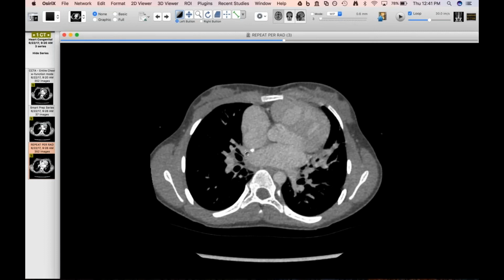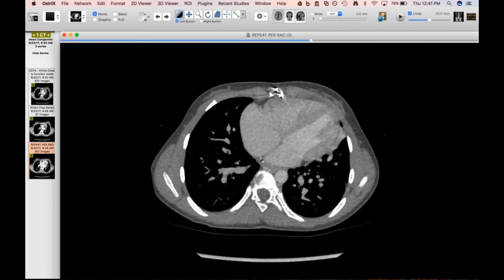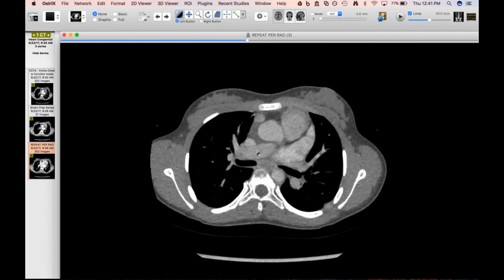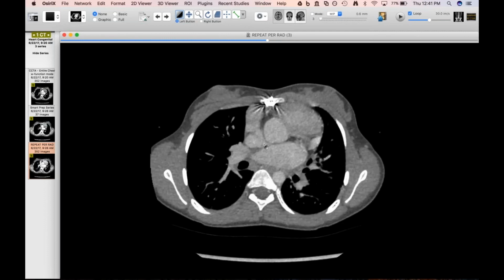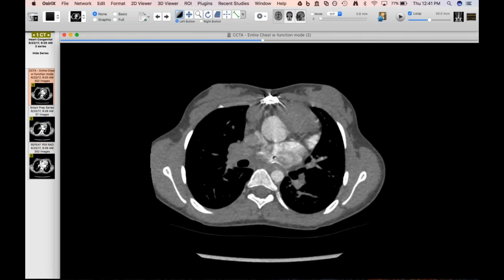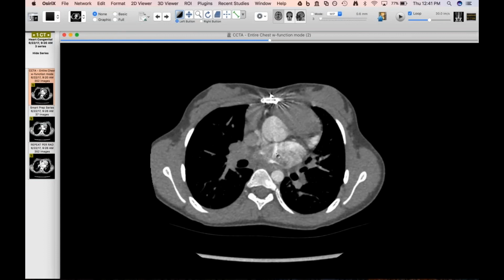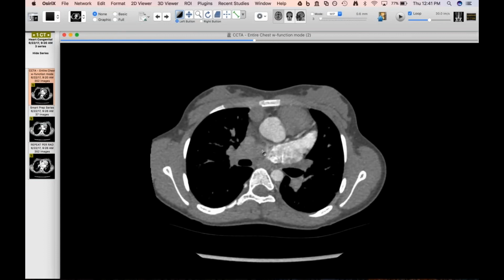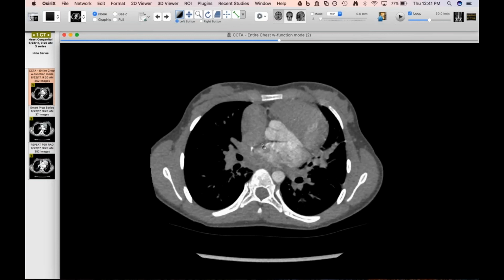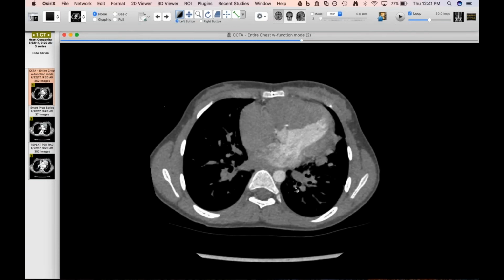No, I don't know if this was probably related to her surgery when they went in and repaired the VSD. I bet they did an atriotomy at that time. I don't know. The other thing is that she does have this weird little thing right here, and I can't tell, there's a little bit of motion. I can't tell if this is a little accessory left atrial appendage or if this is actually communicating. I think it probably is communicating. So she might have a tiny ASD, I don't know.